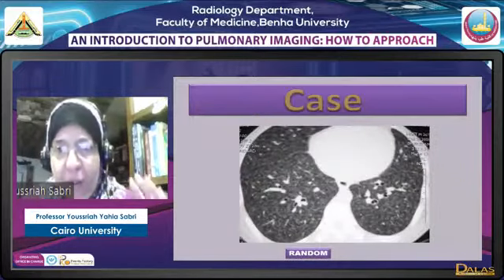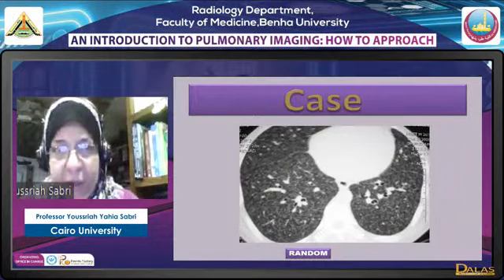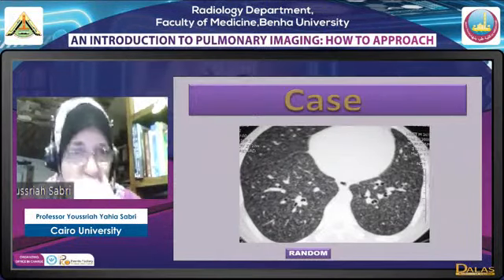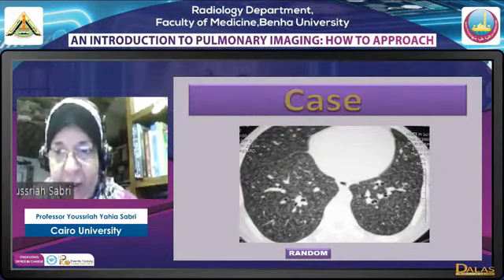This is random, this is miliary. This is a 26-year-old male, and the miliary pattern differential diagnosis is extremely wide, as we used to take in the third year of college. All that end with osis is miliary: sarcoidosis, tuberculosis, pneumoconiosis, etc.